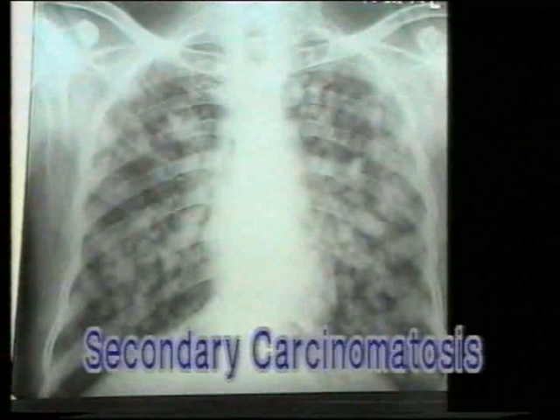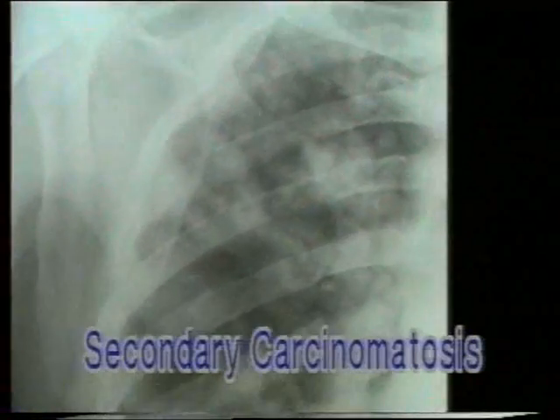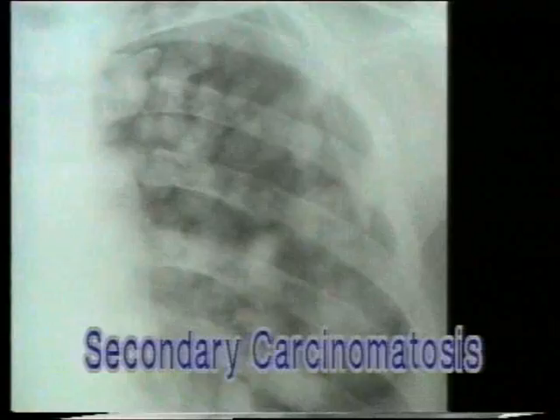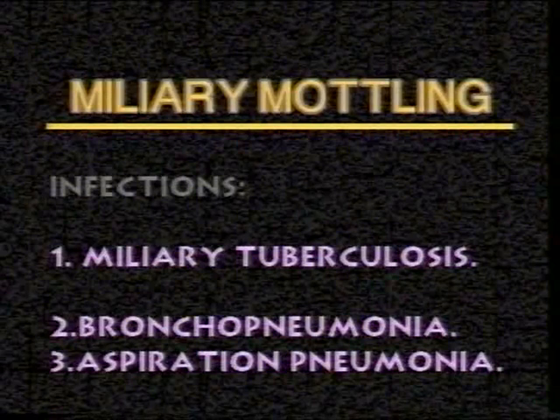This is another X-ray showing secondary carcinomatosis. Note the opacities, varying in size, confluent, and in large numbers. A variety of conditions may produce such miliary mottling, and a clinical correlation may be necessary.